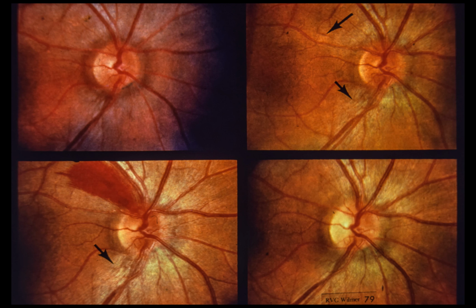Over the next 3 months, there was progressive visual loss in the right eye. Lower left. 3 months after the onset of right eye visual loss, the right optic disc is moderately hyperemic, and the peripapillary telangiectatic vessels have become more obvious. A superficial, flame-shaped hemorrhage is seen at the superior temporal pole of the optic disc. A fluorescein angiogram demonstrated no leakage from either disc or peripapillary retinal vessels. The patient's vision continued to decrease.